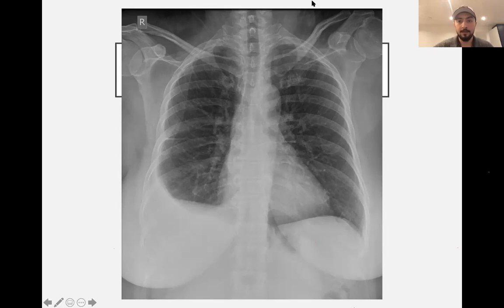Well done. Good job. So just a quick note, this sign has a specific name, which you identified. It's called the meniscus sign. And it is characteristic of unilateral or bilateral pleural effusion. So you can also throw in that name if you want to impress the examiner even more, but it's good in general.